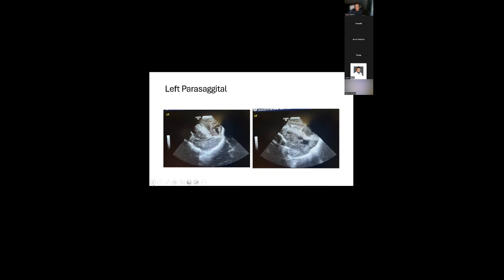And with you getting a diagnosis of trisomy 18, and a history of fall, potentially, that's very important. Very interesting scan. It's very difficult when you have such a distorted midline view. So my compliments. Well done.